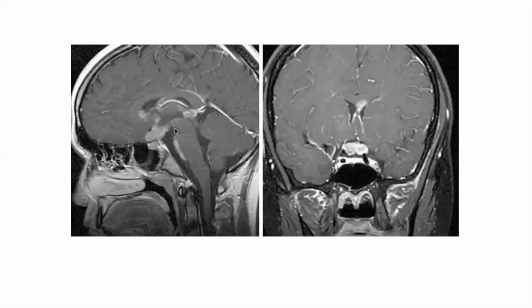Now, this patient also has a germinoma, but you'll notice there's abnormal, irregular enhancement of the region of the pineal gland. And you'll also see some enhancement here in the region of the corpus callosum, sort of subependymal, up here. So this multifocal involvement also favors a germinoma. So keep that in mind, especially when you see this kind of irregular enhancement associated with DI in the suprasellar region.